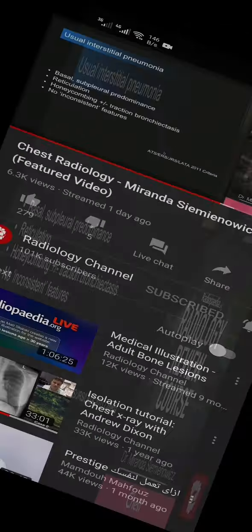So the combined American, European, Japanese, Latin American Thoracic Association criteria for the diagnosis of UIP on CT is basal peripheral predominance, reticulation, honeycombing, plus or minus traction bronchiectasis, and no so-called inconsistent features. When you're reporting fibrotic lung disease, you're trying to categorise into one of three categories. You've got definite UIP, which is what this is.